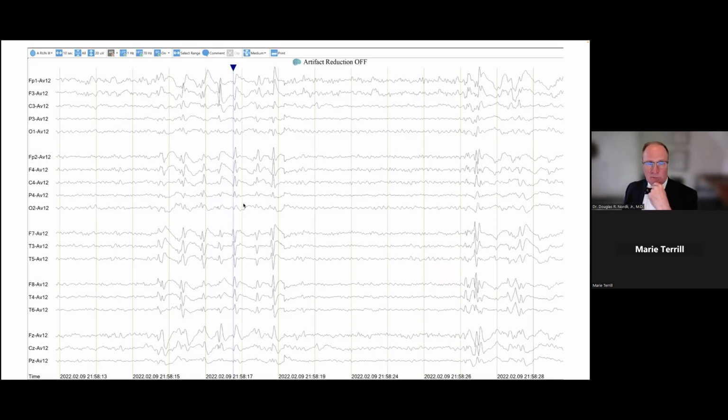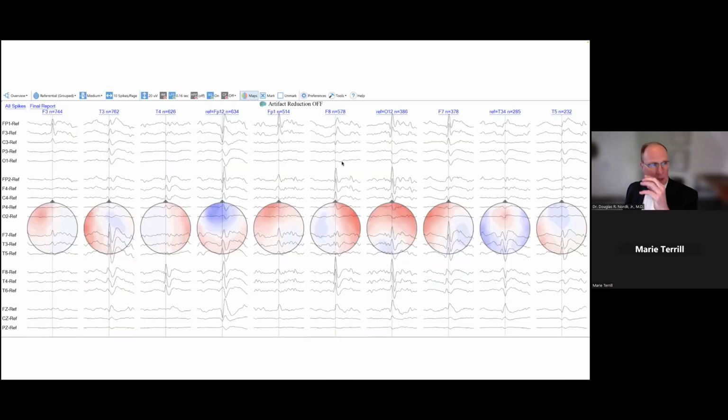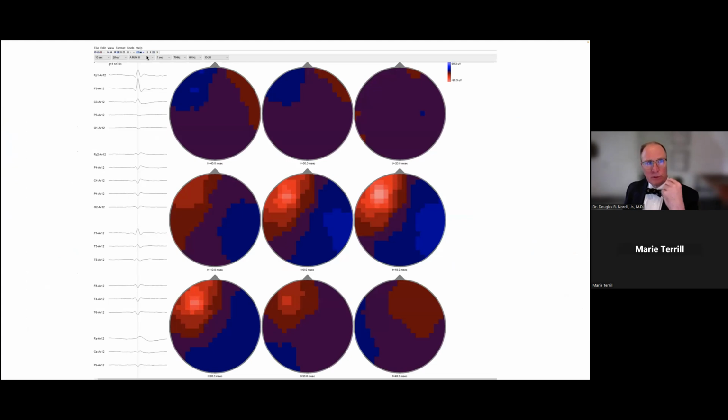Here's one example of how you do it. You take an EEG that's showing you epileptiform discharges. You then analyze the spike report. You select the group that you're most interested in. And then you could go through that group and, of course, handpick. You could also say, well, let me take the entire group. And then you can export that to a V-plot and render it here. And here you can see it showing all 744 spikes, and you can display it over time.